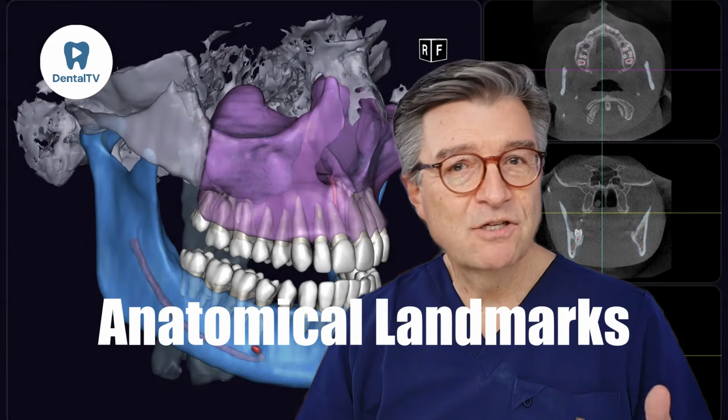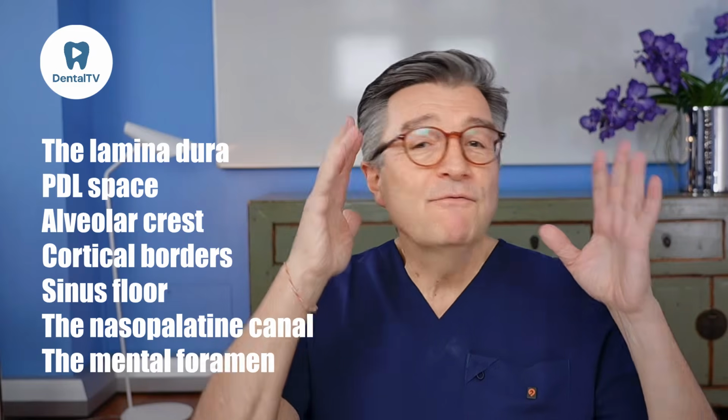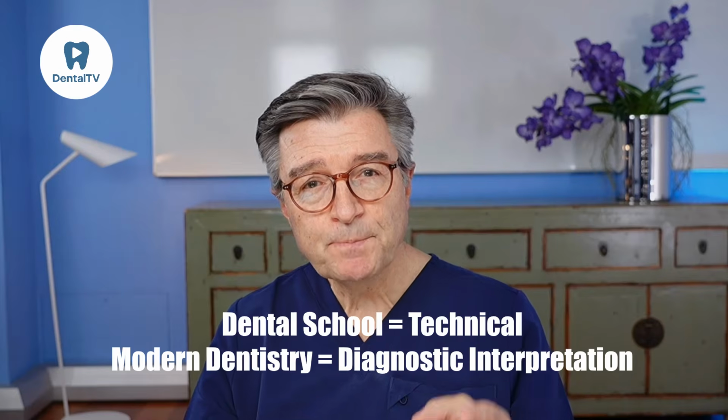We memorized anatomical landmarks: the lamina dura, PDL space, alveolar crest, cortical borders, sinus floor, the nasopalatine canal, the mental foramen, important structures, but we were rarely taught how these landmarks help us avoid false diagnosis. And this is the big gap. Dental school taught the what, but not the how. You learned what structures look like, but not how to interpret patterns, how to reason for imaging, or how to connect 2D information with clinical findings, photography, or 3D scans. So let's build that foundation now.